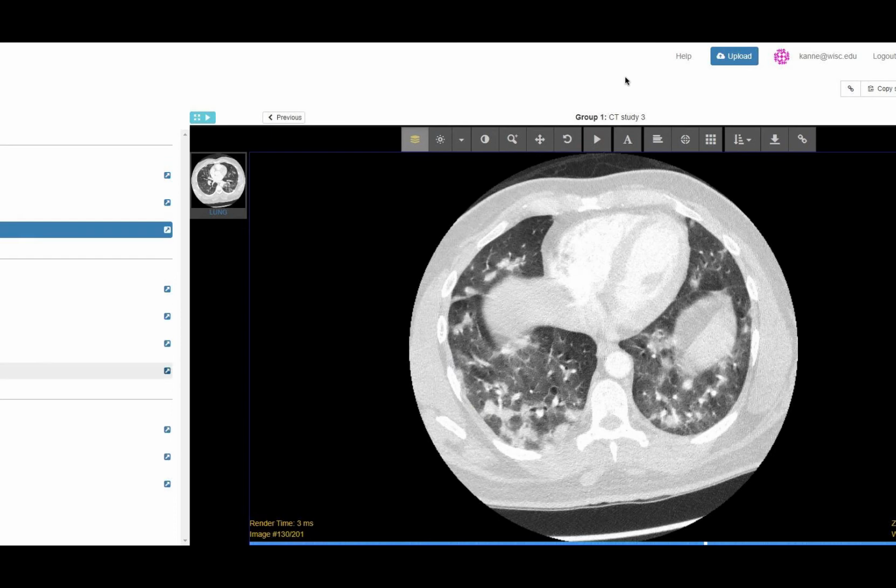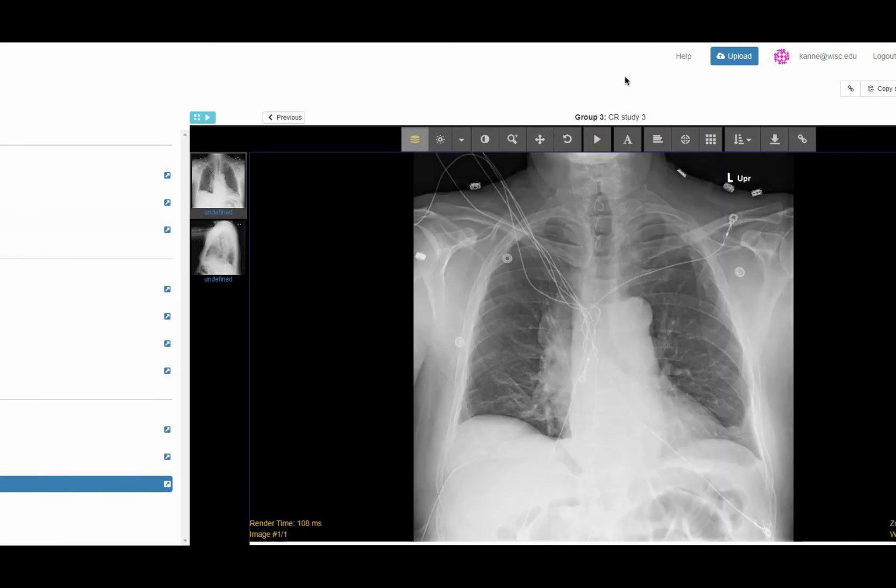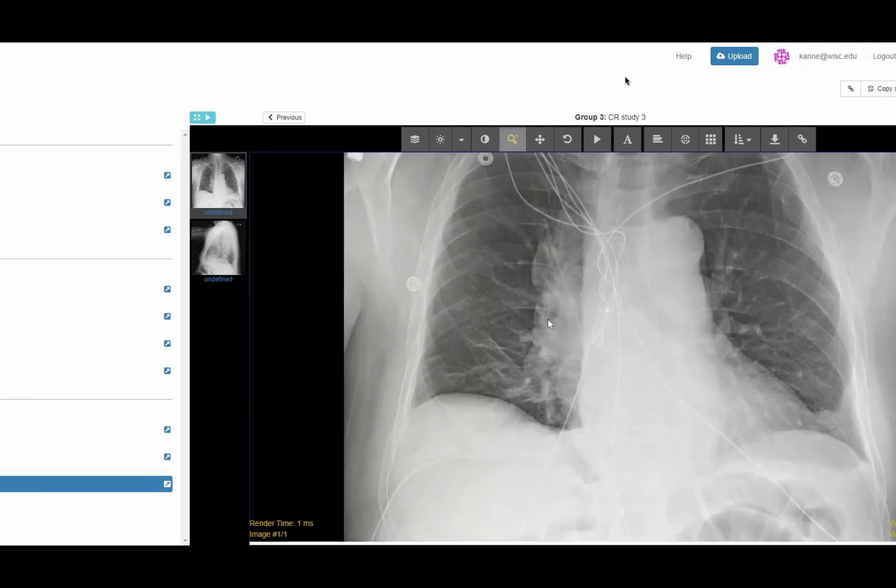Okay, what study is this one here? This is a great study, and one of my colleagues made a good observation. It's just going to take a second to load the radiograph. This patient had an esophageal cancer and underwent esophagectomy and a pull-through procedure. You can see the conduit there, and I don't know how well it's going to show up, but let's make it bigger.